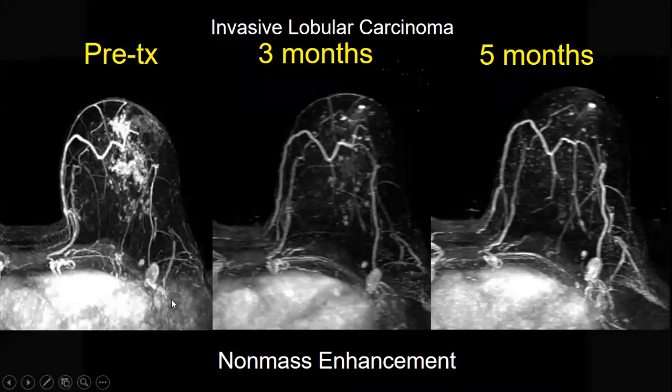And then you have here the lobular carcinoma, which is presenting as a segmental non-mass enhancement before therapy, 3 months after therapy, and 5 months after therapy. You see that within the breast parenchyma, nearly complete resolution. In the adenopathy itself, it remains. And we know that because remember we talked about the fact that neoadjuvant therapy is more effective in the breast than the lymph nodes per se.